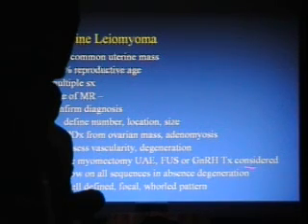And this is getting to be more and more important because we're doing many more different types of treatments for leiomyomas, and they depend on the number, the location, and the size and type of fibroid, as you'll see in a second. We need to help differentiate this from big masses. Is a pedunculated fibroid or mass, for example, a common dilemma?